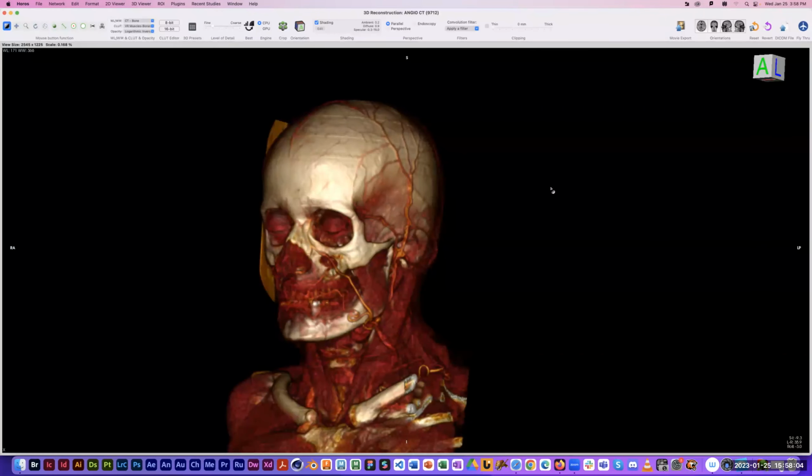I'm going to show you one other little tool quick, and then I think I'll be done, and you can just use the rest of the class time to do your renders. Right next to the scissor tool is a little tool that's skull and crossbones. I would pay close attention to the icon and use it as a word of warning. Don't ever use it, because it does not work well.